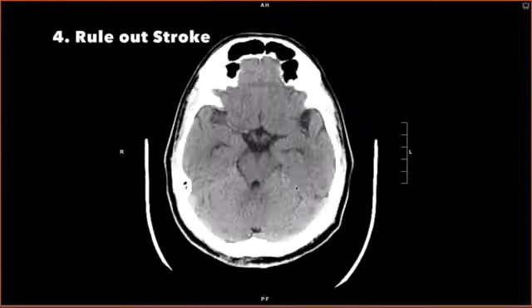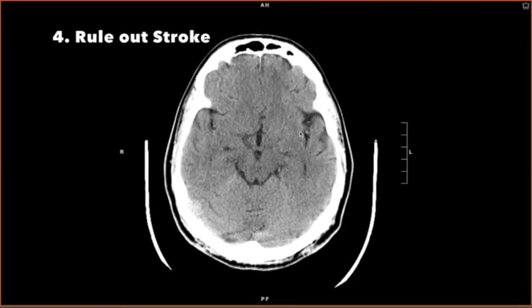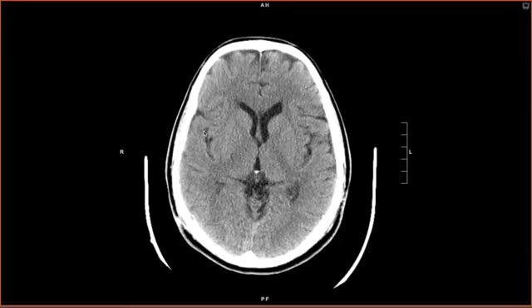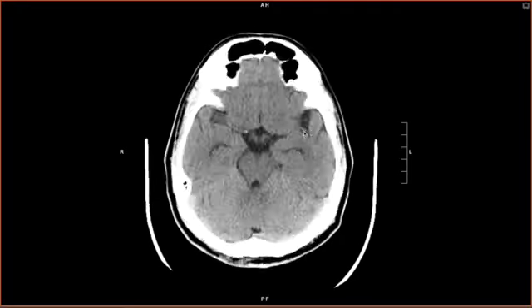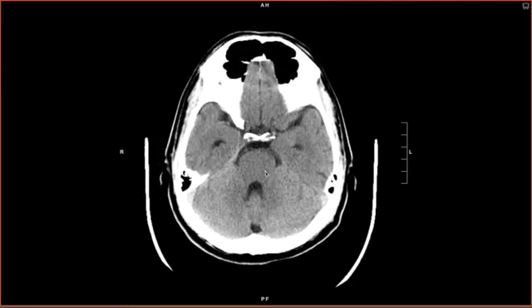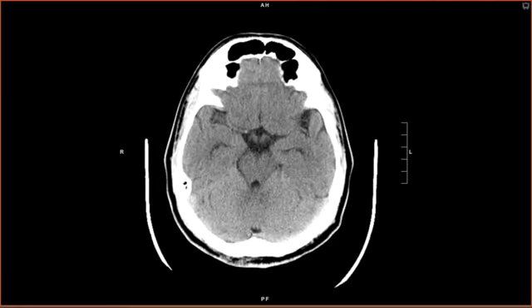Then you assess for stroke. First, start by looking for hyperdense vessel. So I start in my simplified conceptual approach by looking at the M1s bilaterally, and then looking in the Sylvian fissure for any hyperdense vessel there. Then looking at the basilar artery for a bright basilar, suggesting clot there. Then I look for gray-white differentiation, so put it on the stroke window.